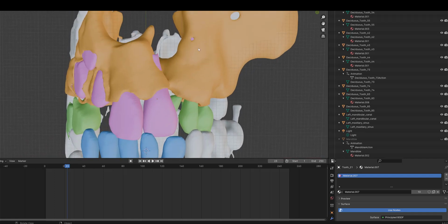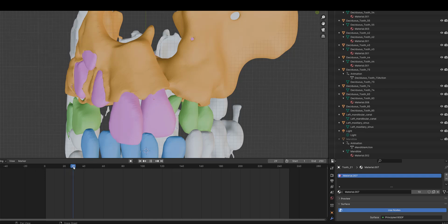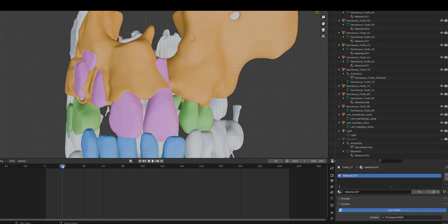You can see that immediately there is already the canine starting to grow into the cleft, which is not good. And the root of the central incisor is protruding into the cleft, which would need to be corrected. So already a big advantage. The first step for us is to hide the root into the bone by using segmented mechanics or any type of mechanics, and to immediately think about grafting, because you really want to get the canine into bone, not into the cleft, which may end up not having as successful an outcome as planned.